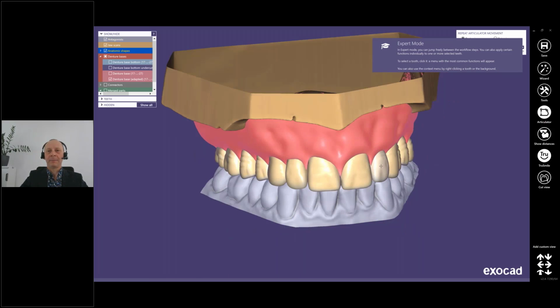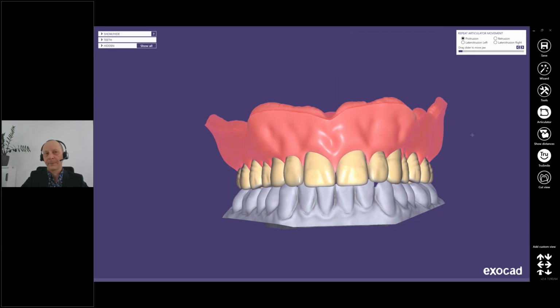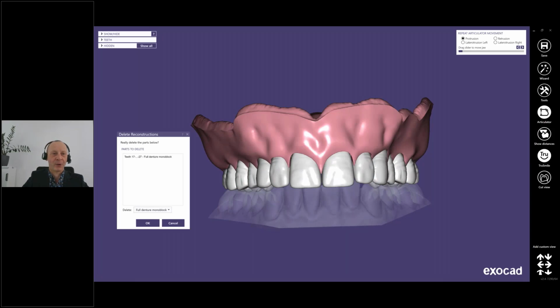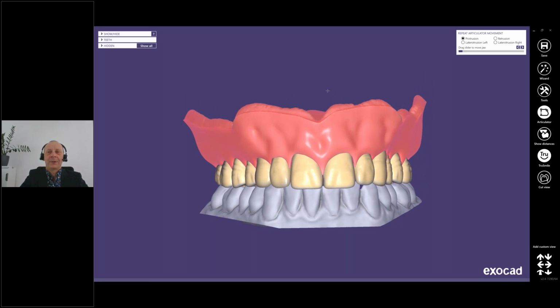Good idea, before you continue in expert mode, I very highly recommend to delete merged parts first. Please don't worry, you don't delete your job, you delete only merged parts, so only output data. This is important.